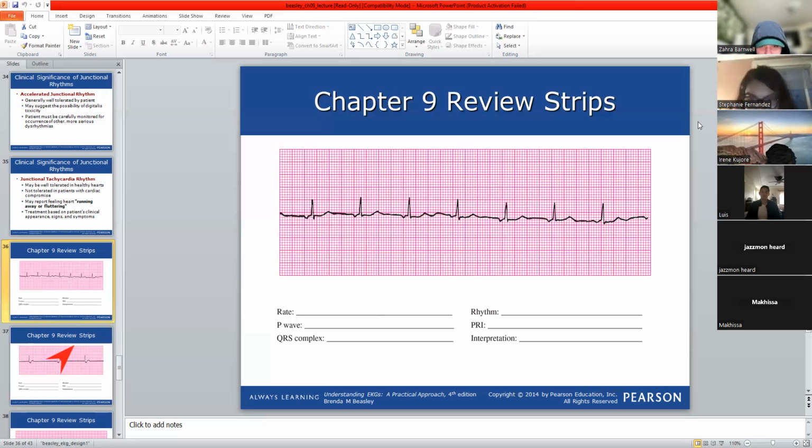Okay. Let's see. I think it's like 3 boxes. Very good. So 3 boxes means what?